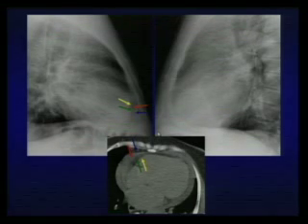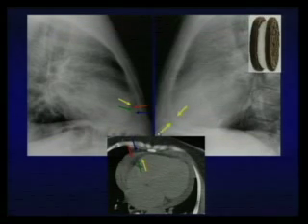If you focus your sight in the other case, you can see that here you have a lucency that is the epicardial fat tissue. Then you have a thick opacity that is the pericardial effusion, and it is surrounded by another hypodensity here that is the fat tissue in the mediastinum, and this is the Oreo cookie sign. So the fat tissue represents the layers of the cookie, and the pericardial effusion is representing the cream of the cookie.